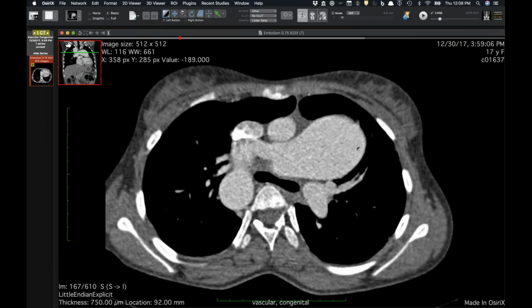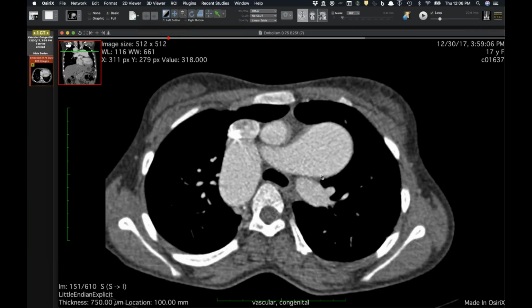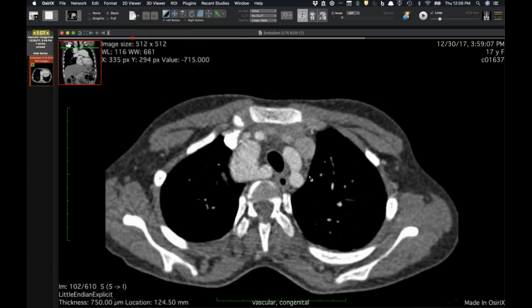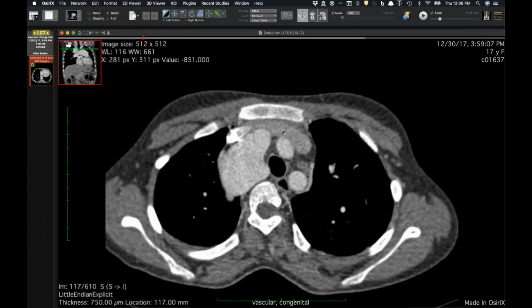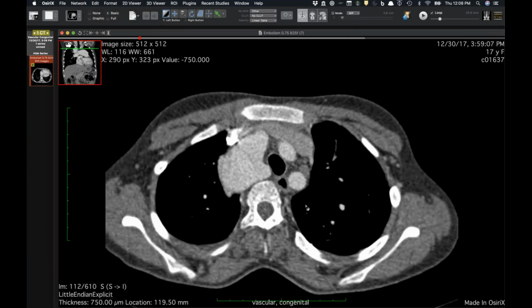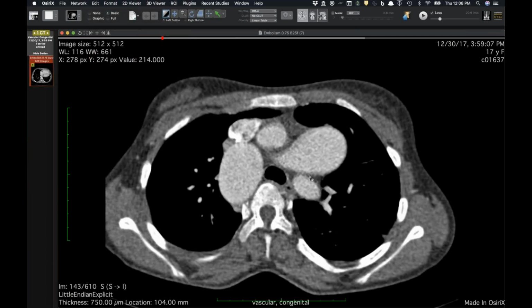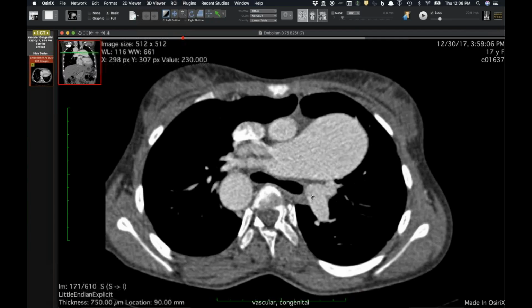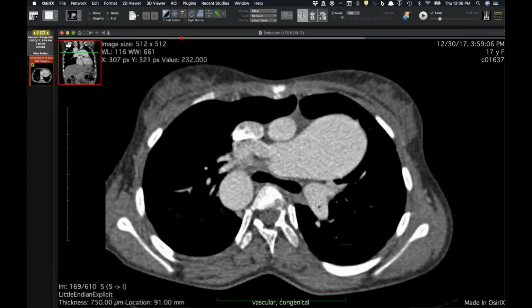And when you look at the pulmonary artery, you see the same thing. The proximal pulmonary artery is interrupted, except in this case, there is supply from the left subclavian artery. So the same thing happens where the proximal pulmonary artery from the sixth aortic arch regresses. But in this case, the ductus maintained its patency and is supplying this left pulmonary artery.